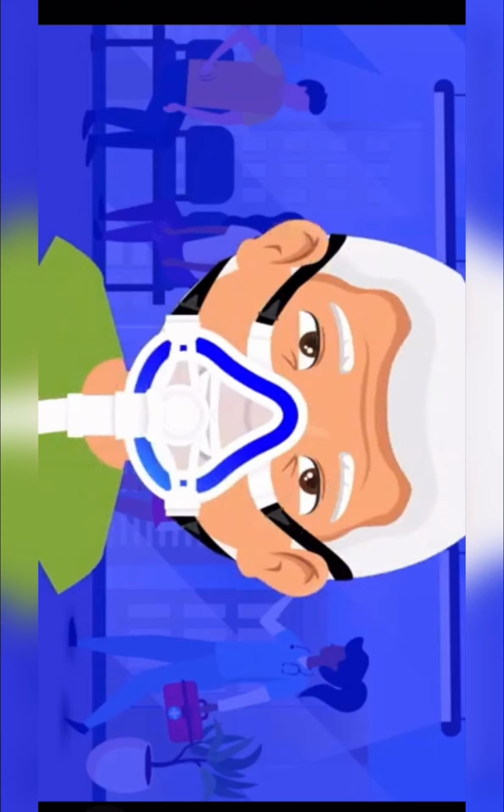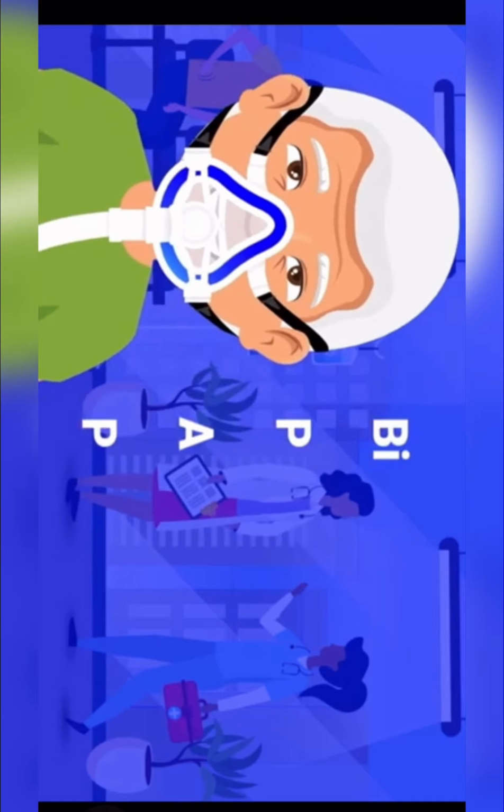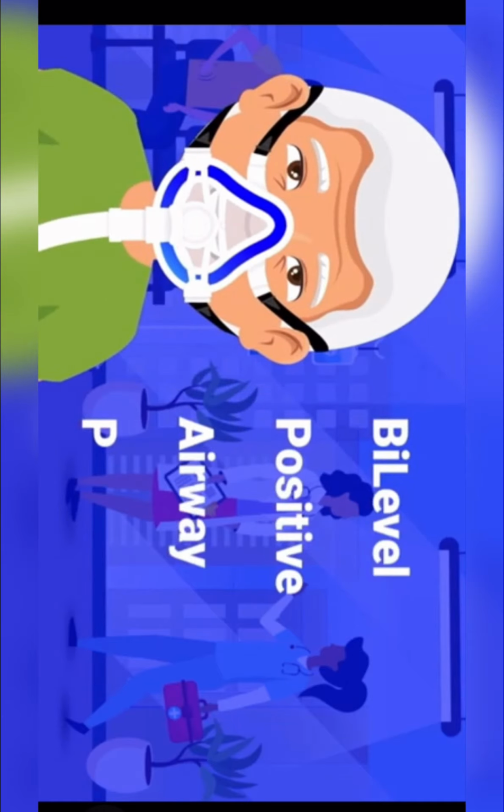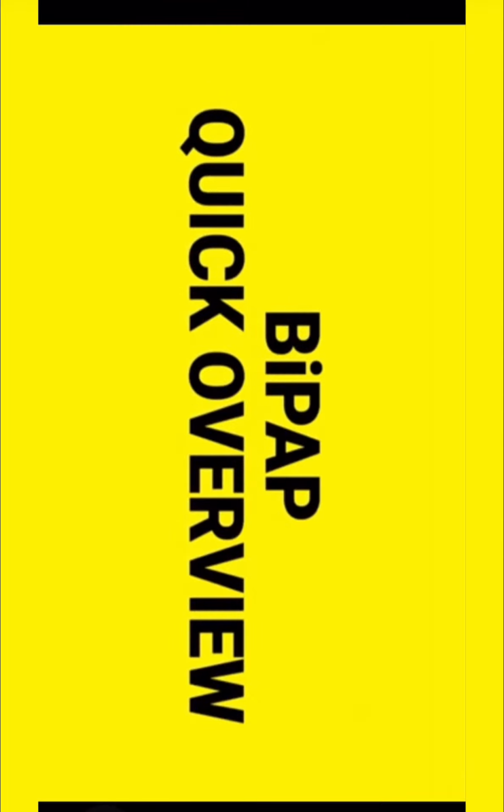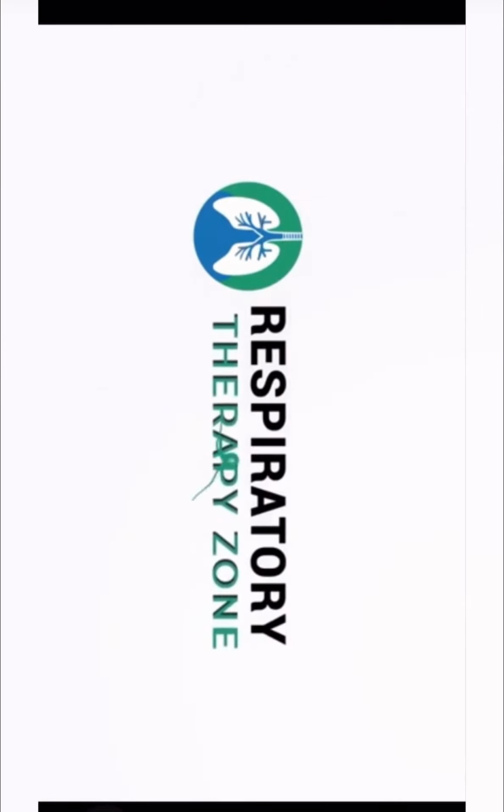Let's go. The BiPAP, in this animation video, refers to bi-level positive airway pressure. BiPAP is a form of non-invasive ventilation commonly used in the field of respiratory care. If you want a quick overview of the BiPAP, keep watching this animation video. Through this respiratory therapy zone, we're going to learn more information.